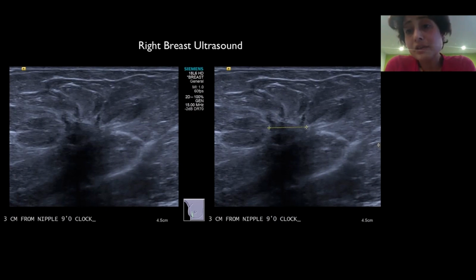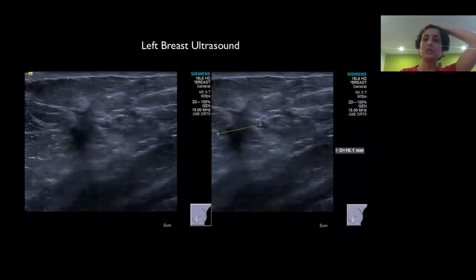What I would say for this lesion is that it is breaking the continuity of the breast tissue. It is causing a distortion there. It is causing a break in the normal architecture of the breast. So in between those fat lobules, you suddenly see this thing coming and disrupting it, which tells me that this is a breast cancer. And that's on the left side, so left inner half.